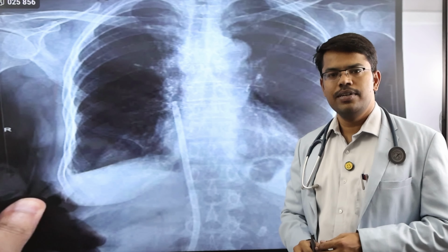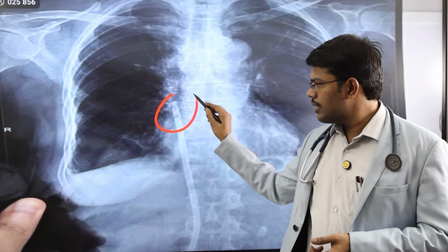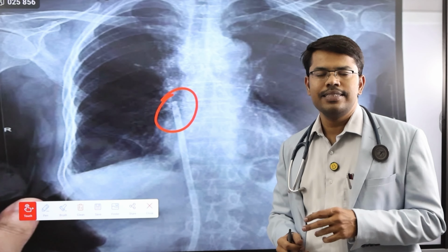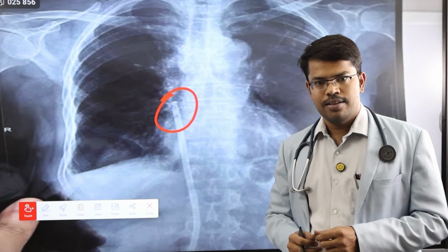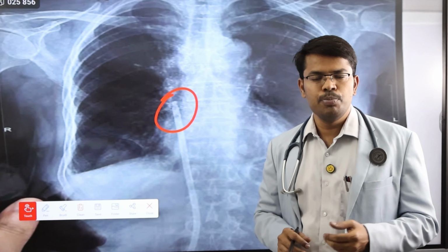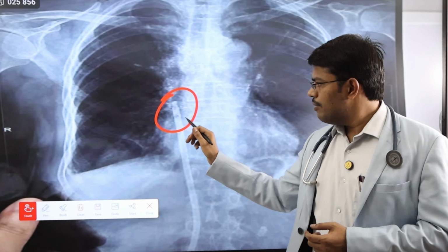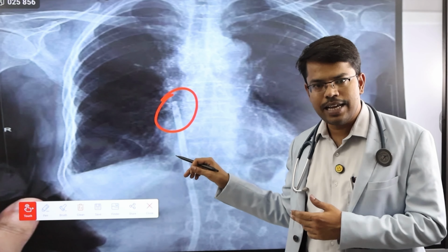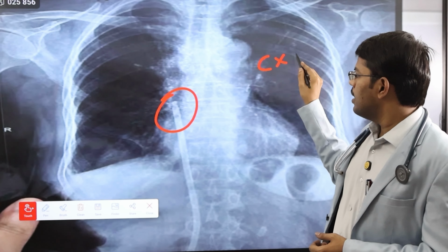And why not the risk of DVT? Compared to a non-tunneled catheter, the perma cath's material is somewhat superior, so the chances of thrombus generation are reduced. The material of the catheter is of a bit superior quality than the simple catheter, so the longevity is assured. The vessel damage which occurs if it is in a particular vessel, and the suctioning effect, can be minimized if it is in the heart. So this is related to this particular X-ray.